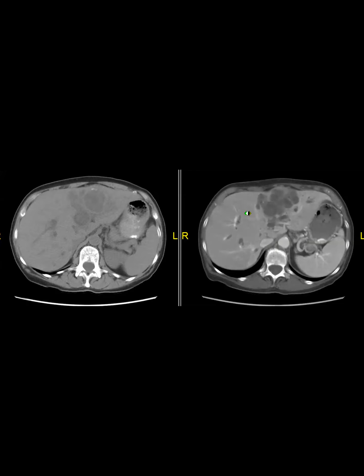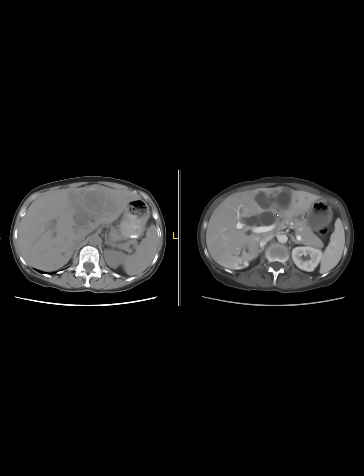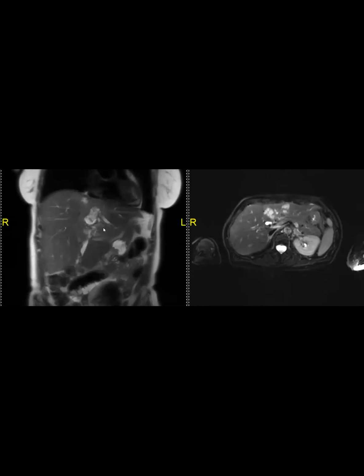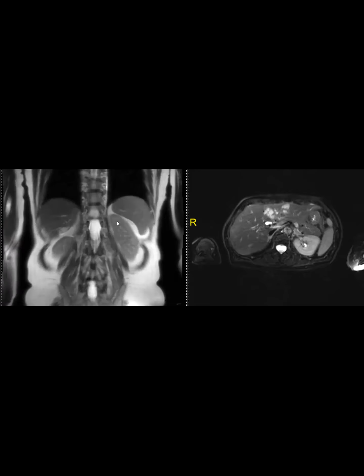No, I think we should talk about it. So it looked like a super dilated bile duct and then super dilated ducts in the left lobe. And I'm wondering about an IPNB. Right. So this is probably the most extensive case I've seen. You can see the CT and MR were done within, I think, a month of each other.